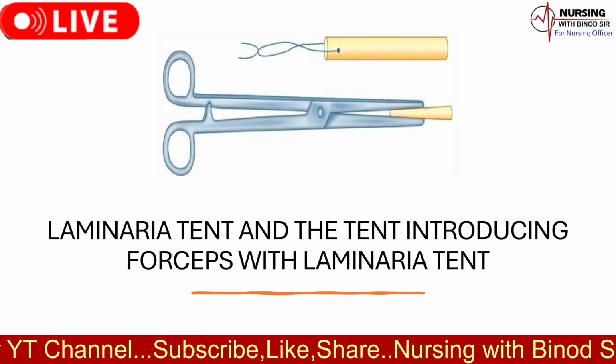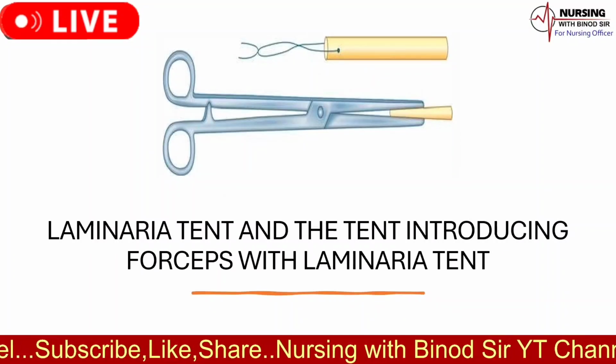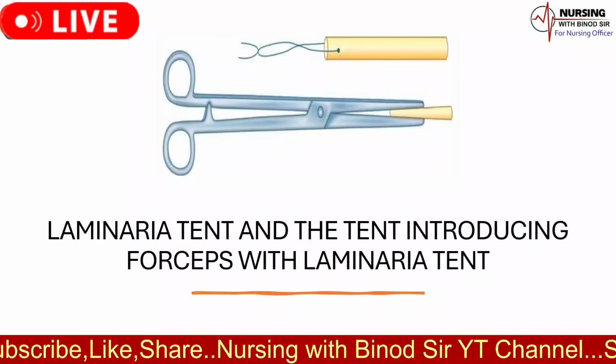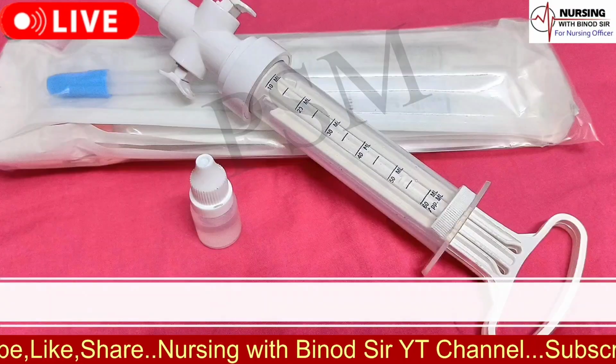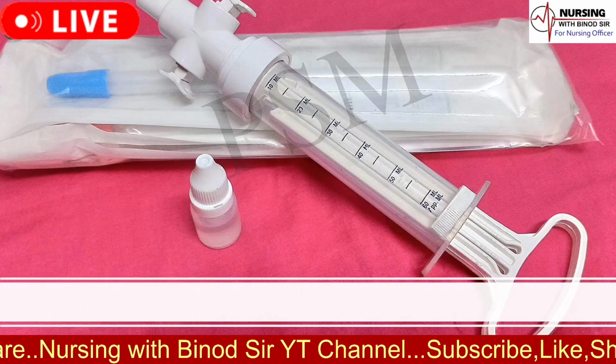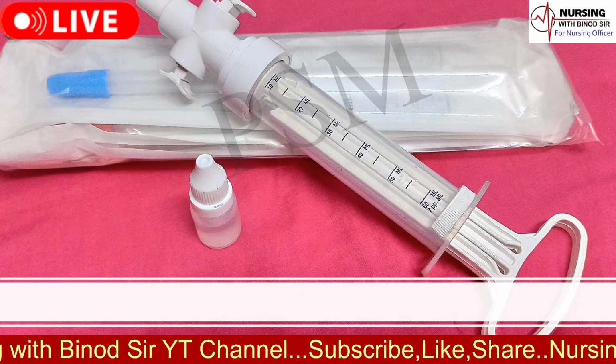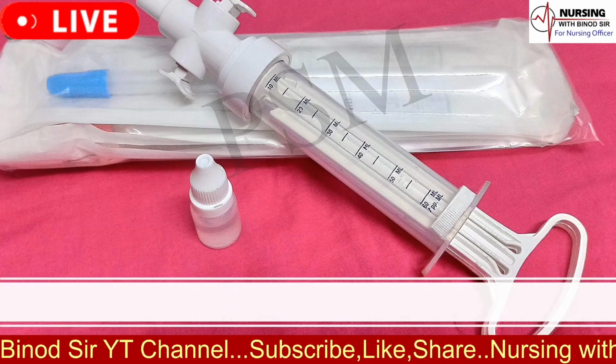useful in cases where multiple laminaria tents need to be inserted over 1 or 2 days to achieve desired cervical dilation. The name of the instrument is manual vacuum aspiration, MVA, syringe. The uses of manual vacuum aspiration, MVA, syringe is as follows.